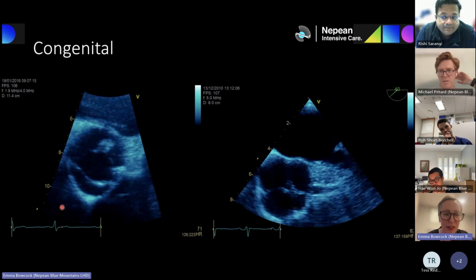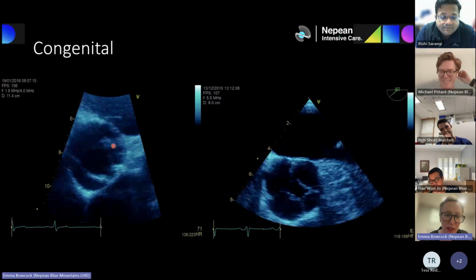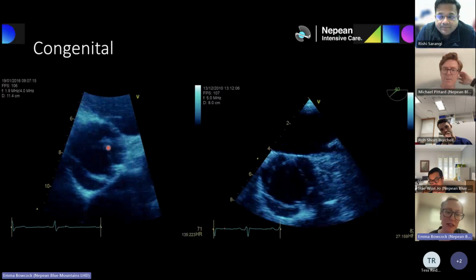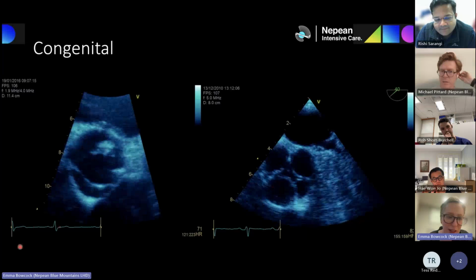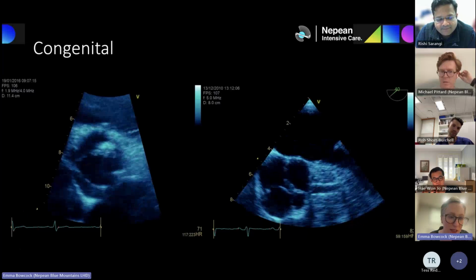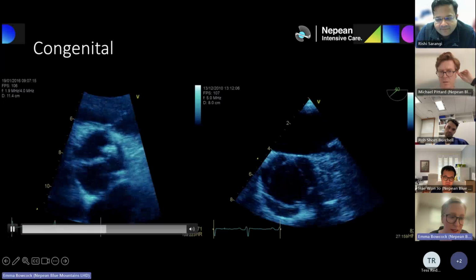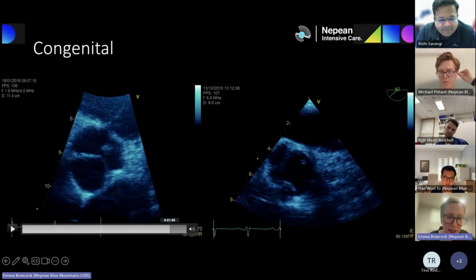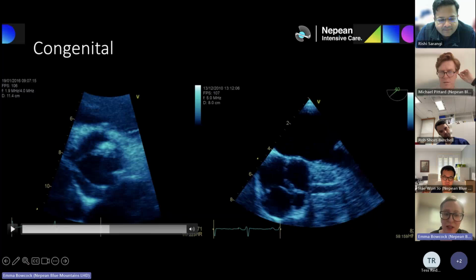Love it. It's brilliant. Perfect. Yeah. And this is the raphe here. We talked about this last week, but that elliptical opening. So if we pause it in mid-systole, and just to show everyone that as well, rather than that triangular opening, we're seeing that elliptical, lens-shaped opening.